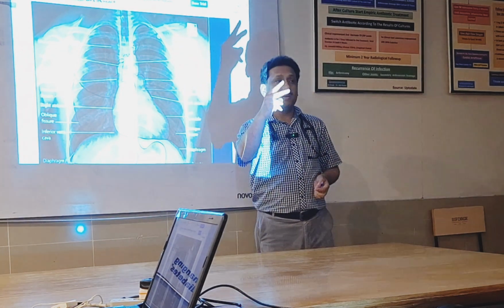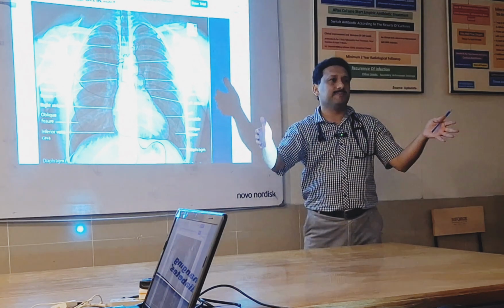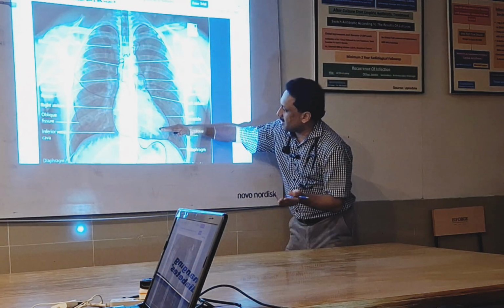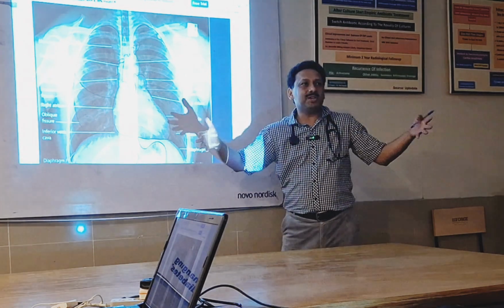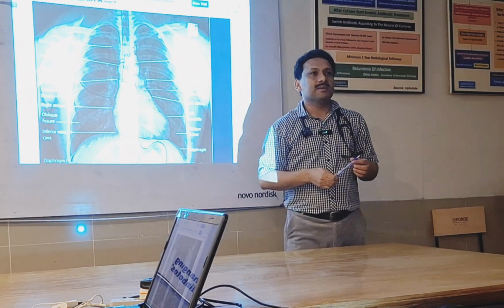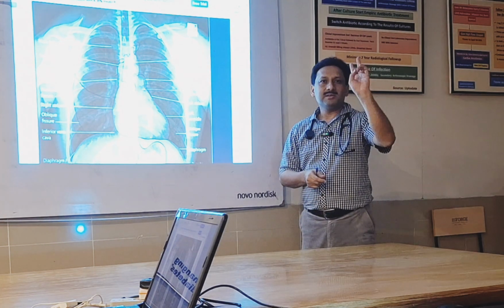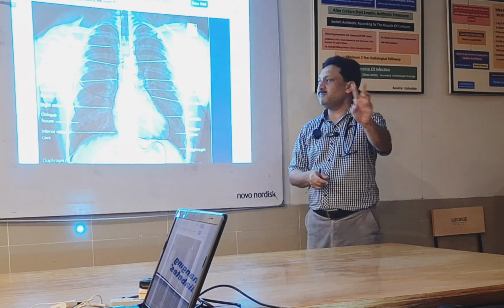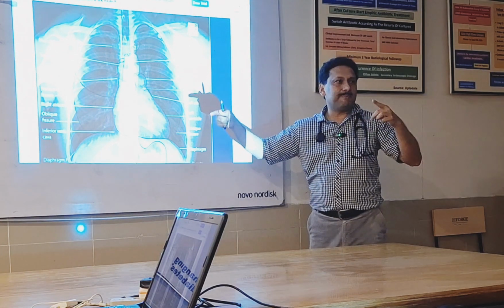The second abnormality which occurs in that setting is that the heart seems enlarged. If we push these diaphragms up here, what will happen? There will be an impression that the heart is enlarged. So one thing, position. Second is respiration. I have told you what bad will happen.